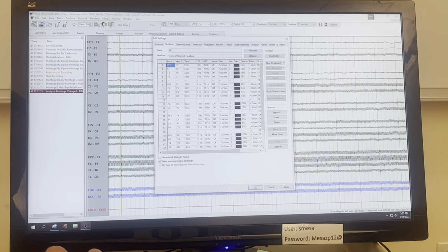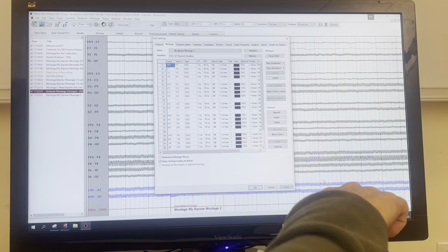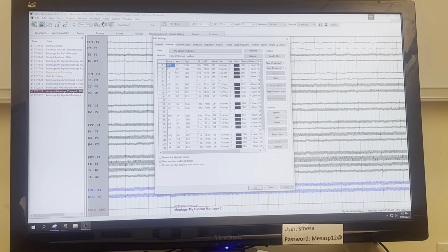So we're just going to call this my bipolar montage 2. You can rename this anything you want. Okay, and then you hit apply. Okay, now it's going to come here. And now we're going to edit it again.